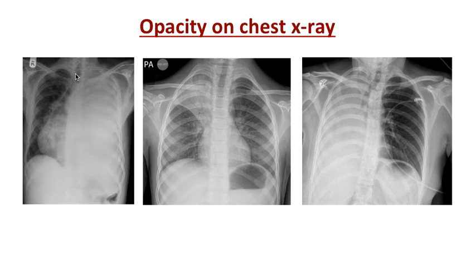Air appears black, you can see the airway, you can see the lung field. So air is appearing black, fluid is appearing white, so there is fluid here which is pushing. So what could this be? This is pleural effusion. Now look at the second X-ray.